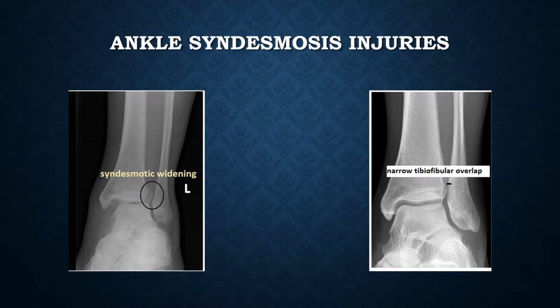Keep in mind that these are more obvious frank syndesmosis injuries and that a more subtle injury may necessitate a more specific radiographic measurement of the tibiofibular overlap.